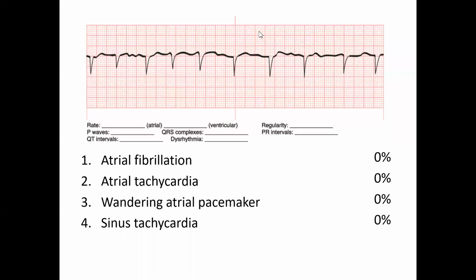one of the things you can do is assess your R to R interval. You could also assess your P to P interval. So if our R to R interval to start out here is about 2.5 boxes, so 2.5 large boxes. Remember, we talked about the difference between our large and small boxes. So the R to R interval between these two, pretty much right on the money at three large boxes. So you went from 2.5 to 3.